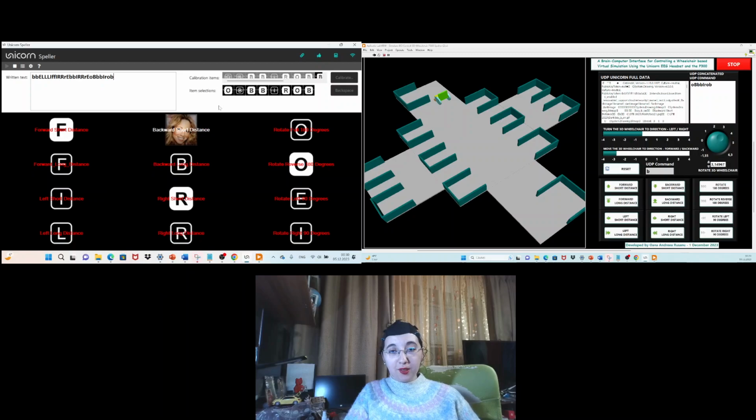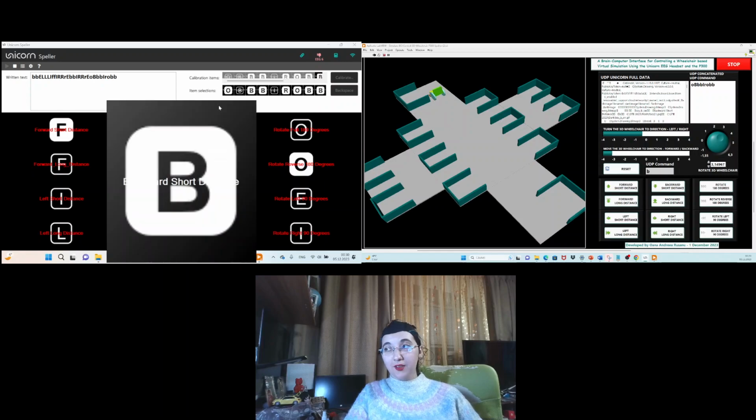Again, backward short distance. Really nice. Next command.